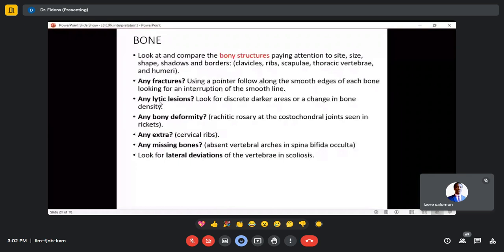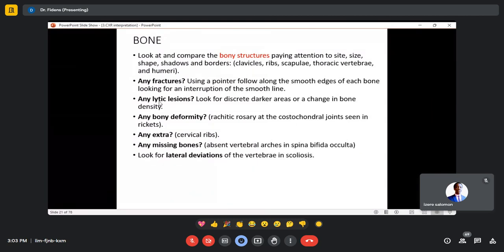It will look black because maybe there is destruction of the bones. Yeah, it is dark. It's even written there, but even in the lung, lucency comes from this lytic. Lucency, that's a dark area. Like pneumothorax is an area without any vessel. That's pneumothorax. So it is opposite to opacity, opaque. Lytic, opaque. They are opposites.